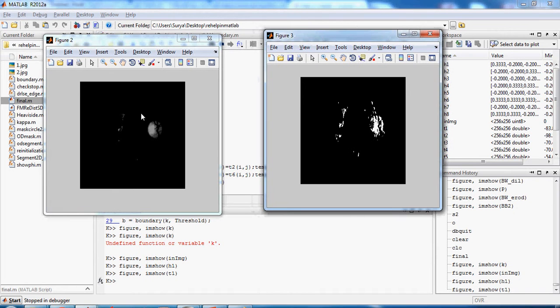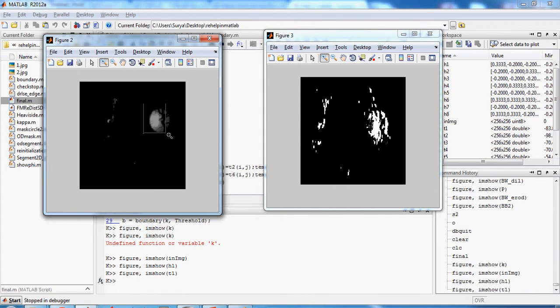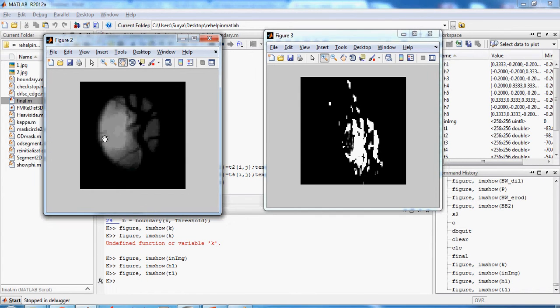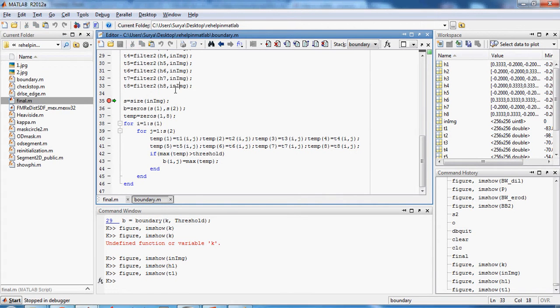This is the input image, and when you apply the gradient, what you get is this. Now the gradient in the x direction, let me zoom into the optical disc maybe. It detects the difference in the x direction, so it keeps calculating the gradient like this. It goes in this direction, and whenever it finds a difference, it marks it. So this is all the gradient in the x direction which has been plotted here. I think this should help you understand how gradients work. And let me go forward.